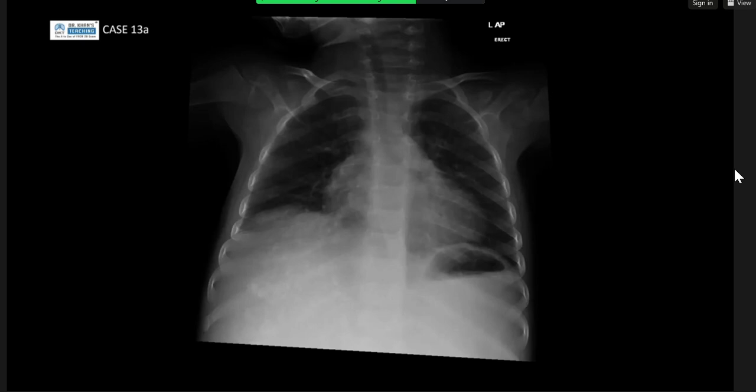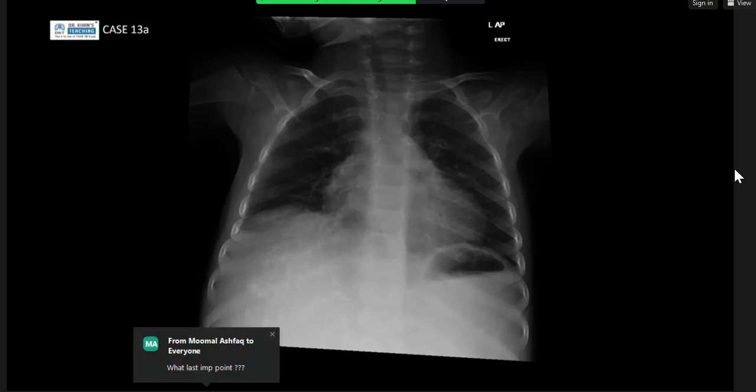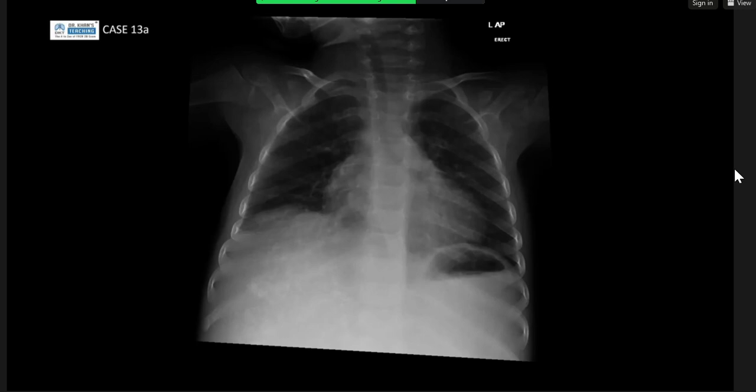I've been provided with a frontal chest radiograph of a skeletally immature patient. I would like to go systematically through the radiograph. Bilateral epiphyses appear unremarkable. Bilateral hila appear unremarkable. There is evidence of an ill-defined opacity overlying the right hemidiaphragm and overlying the right liver. I think I could see a few calcific foci within. There is no pneumothorax, there is no pleural effusion. The visualized bones show no focal lesions or any fractures. So my main finding is the ill-defined opacity with calcification overlying the right hemidiaphragm and the liver.